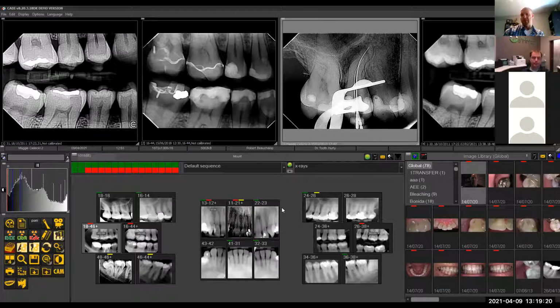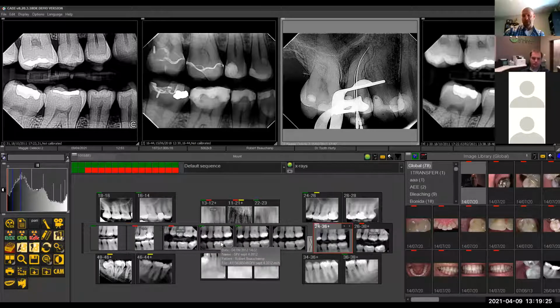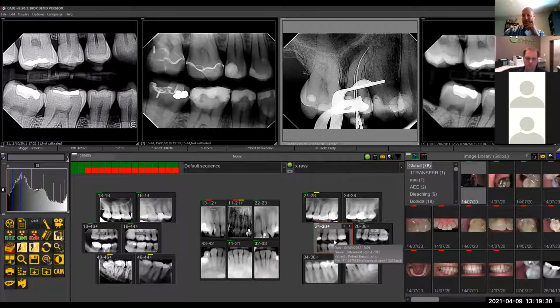If you're really looking for specifics, you could either tile them out and put your mouse over to see the dates of the images, or you can extract the other way if you want to see a specific exam date. This way it saves you from having a multitude of exams saved by date, and having to go searching and cycling through all these exams, then getting one exam up against another and cross-referencing. This is all much sleeker and all in one spot. And we've done this for every piece of multimedia in your practice.